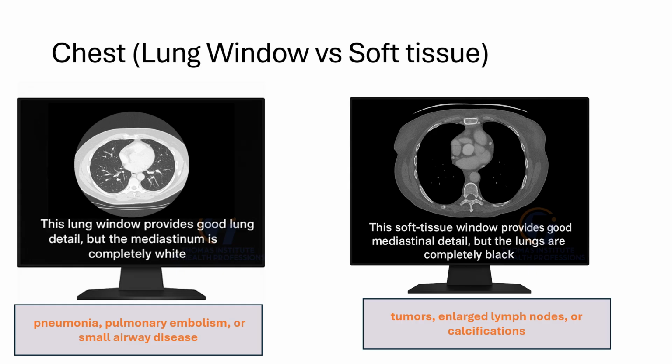As stated earlier, some students often do not realize the same CT data can be displayed many different ways to highlight different tissues. For example, a radiologist may open the lung window first to view the chest. This setting is designed to highlight the air and vessels inside the lungs.